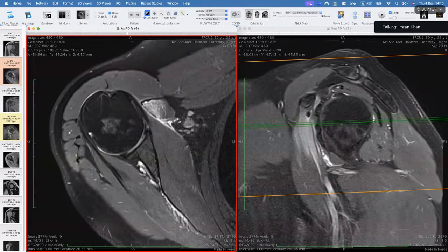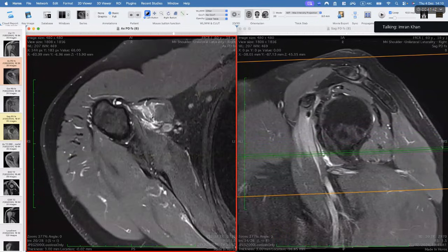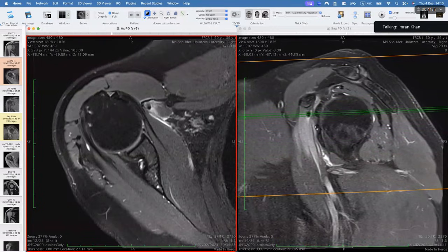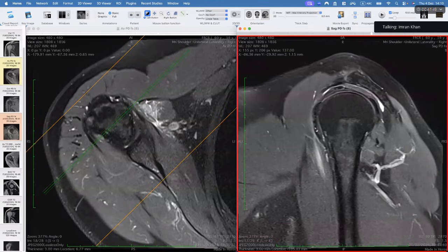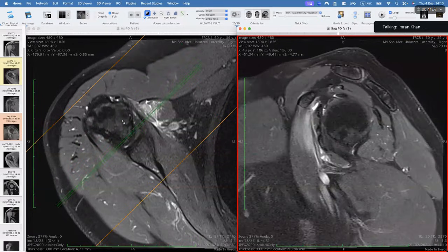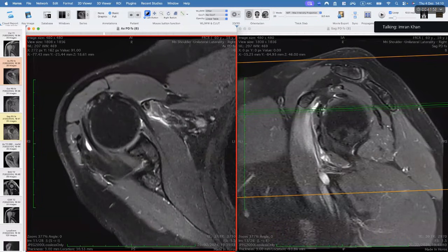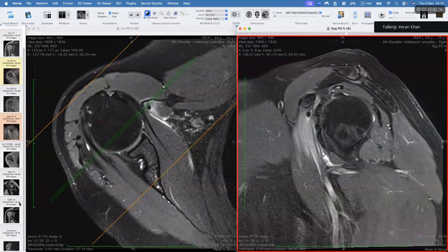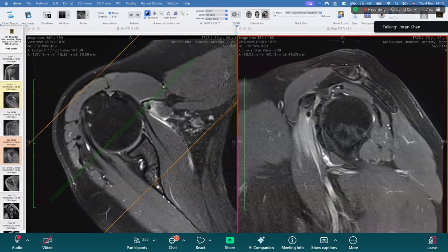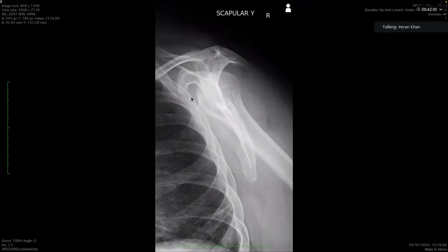Okay, so this is calcific tendinopathy of the short head of the biceps and coracobrachialis. They arise together, and this is what was involved. It's not subscapularis. So the learning point from an anatomy perspective: know the muscles, know the anatomy a little bit. And if you see a dark area in the tendon, check for calcification. It is, in a certain sense, actually visible. I know I'm being a bit unfair on the radiograph, but it is kind of visible just right there.